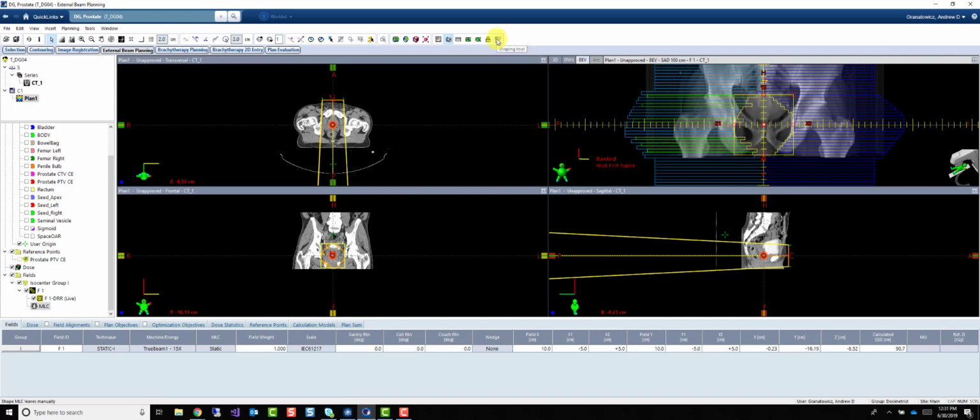Or if I use my shaping tool again, and I draw a shape, whatever shape I draw, so I'm going to close around back here, the MLCs are only going to bounce to the closest red line. So this zigzag line right here, as soon as I complete this, they'll bounce right to that zigzag, but only the highlighted ones will do so. See? They bounce right to that red line.